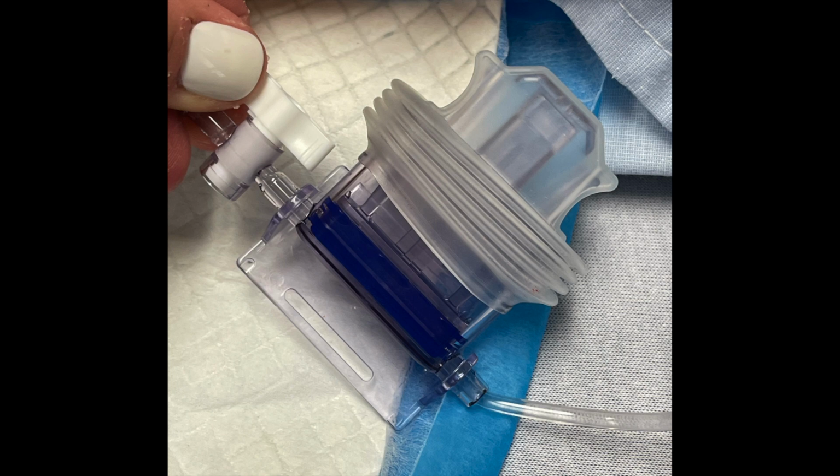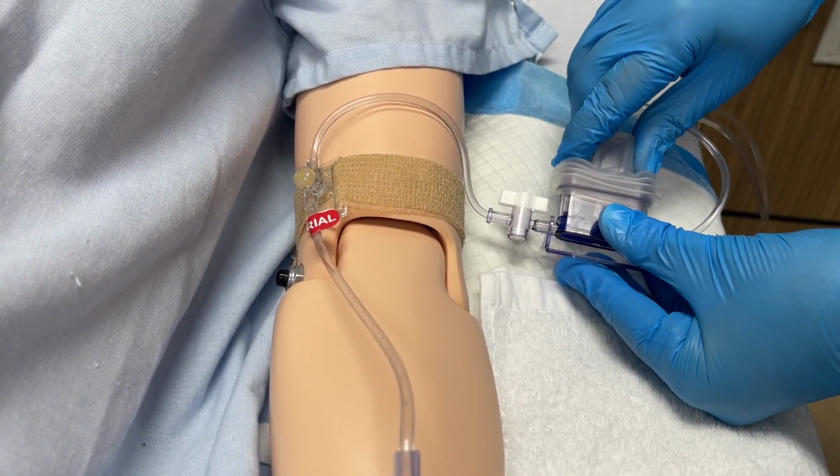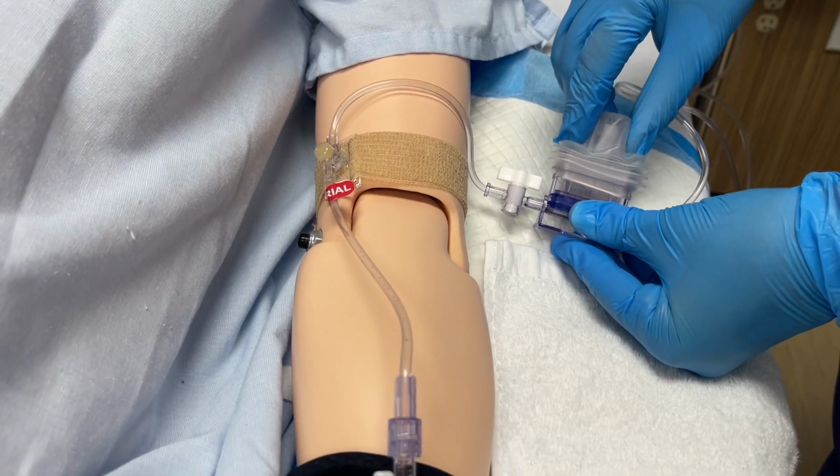These devices come in all shapes and sizes depending on the manufacturer of the line setup. These devices are designed so we can do an inline waste, thus decreasing the amount of accesses in this sterile fluid path line. The safety fluid reservoir of this line has two covered tabs. You will squeeze in on those tabs.